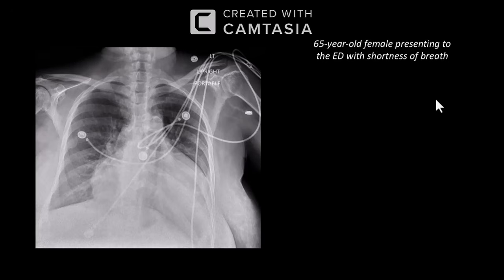Looking at the lung parenchyma, I don't see any evidence of airspace opacity or interstitial edema, but I can see some upper lobe diversion of the vessels with prominence of the vessels in the upper zones. I cannot see any evidence of pneumothorax. Reviewing the bones, I can see bilateral degeneration of the glenohumeral joints. Looking at the ribs, I can see a posterior right what looks like a healed rib fracture. Left, I can't see anything on that side.